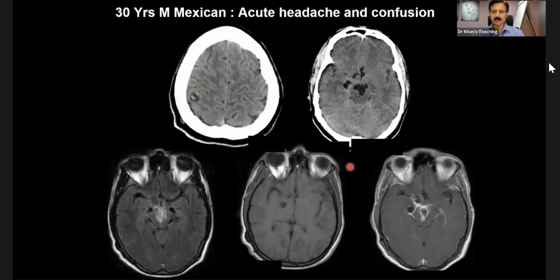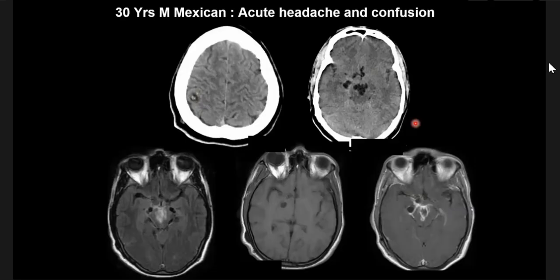So on the top one, without enhancement, there's a calcification. I believe that's vascular. This is not calcification. Let me correct you. So then, how do you explain this? So we have a hyperdense central area with peripheral low density. So what is this stage? And what is this stage? The first one is a colloid. I'm not entirely sure, sorry. Okay, good. At least you remember the word, so I like that. And this is the colloid.